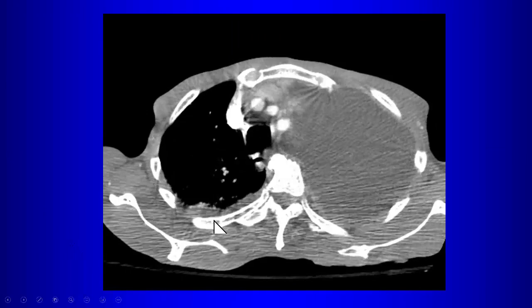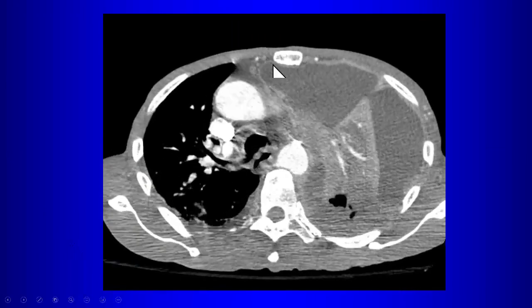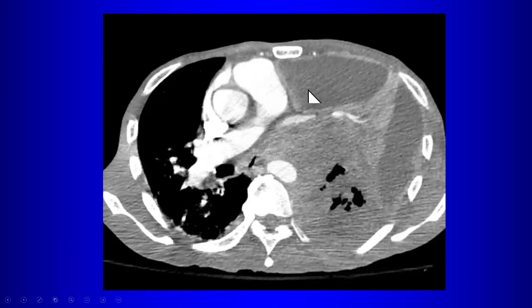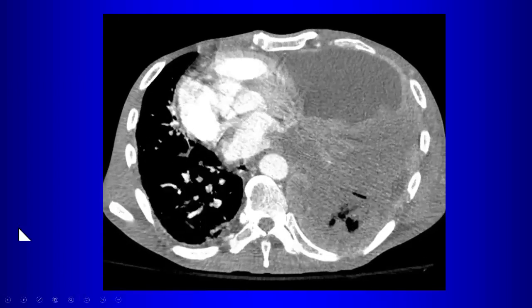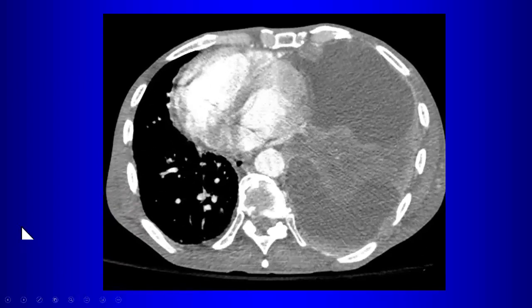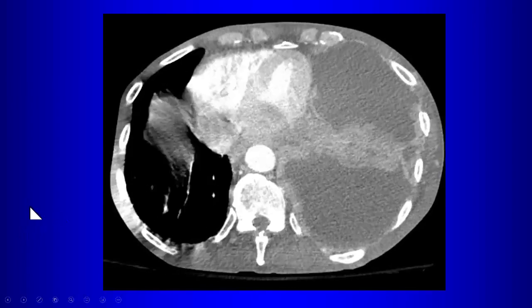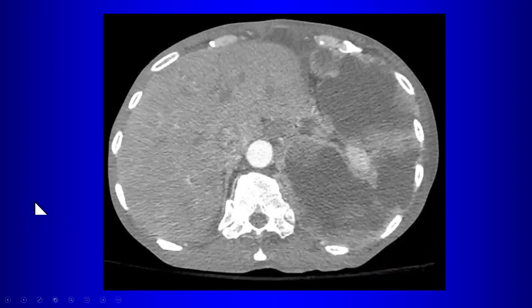And so here's the CT scan on this case. You can see the large effusion. You can see the mediastinal enhancement, the pleural surface. It's not really smooth pleural thickening. It's somewhat nodular and asymmetric, especially there. There's a big necrotic mass over there. You can see the distortion of vessels. Imagine what this scan would look like as a non-contrast CT, trying to figure out what's going on. Okay.